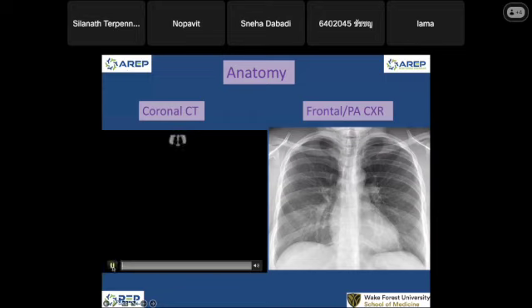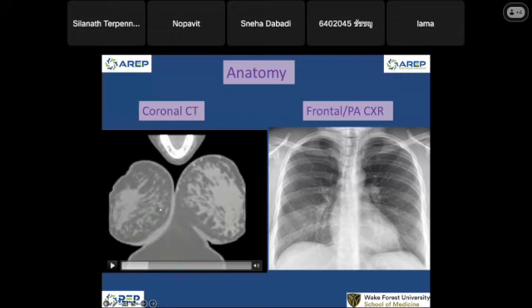Okay, so we'll start from the top. I'm going to stop it. So see that you start seeing something weird here on the top. When you go a little bit further, you see the little air pockets, two air pockets. And then when you go a little bit further, this is the face of the patient. So this is the maxillary sinus. You are responsible for everything in the study. So this is the maxillary sinus. You start seeing mandible here, and then after that we start seeing the breast soft tissue. So this is a female patient, and it's a young patient, with very dense breast soft tissue here.